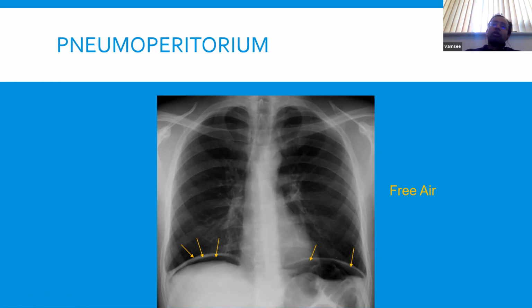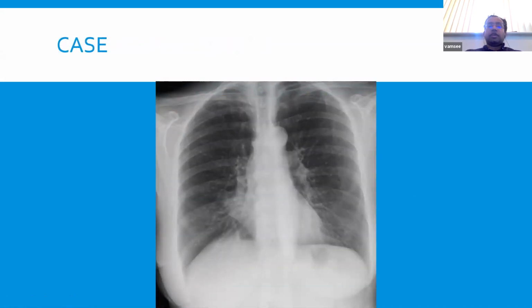Here, I didn't focus on that much when I was selecting this X-ray, but I wonder if this film is slightly rotated, just looking at where the spinous process is in relation to the right versus the left. In this particular case, that doesn't really change the assessment of the chest X-ray, but that's just something to mention. Fine. Does someone want to have a look at this?